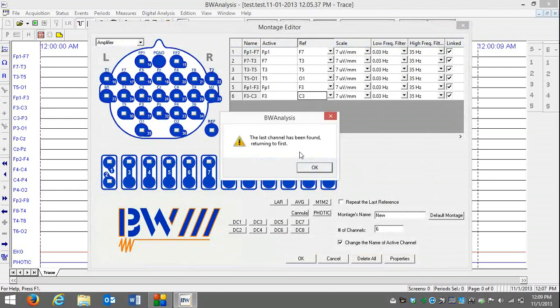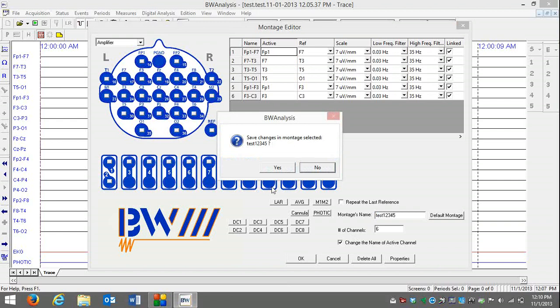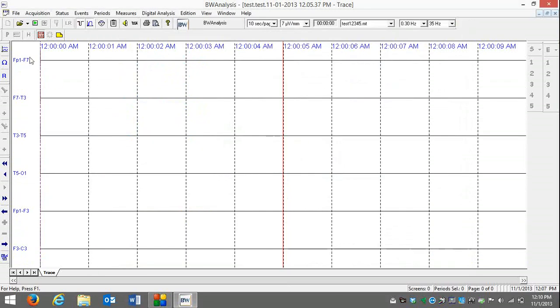Then it's going to let me know that I've reached the last channel. I can continue to add more spaces or save it. If I'm satisfied, I can name it, click OK, and there it is. I've now created a new montage. I can do this before, during, or after at any point through the montage editor.